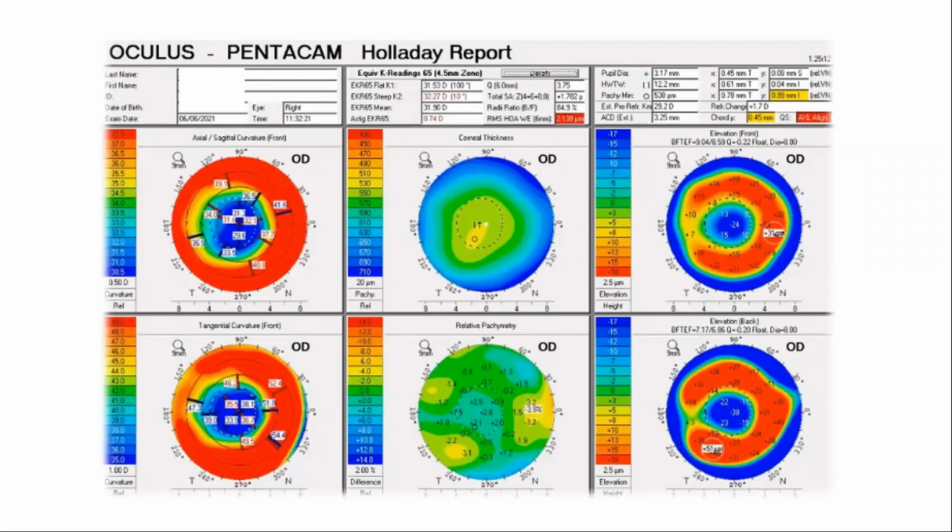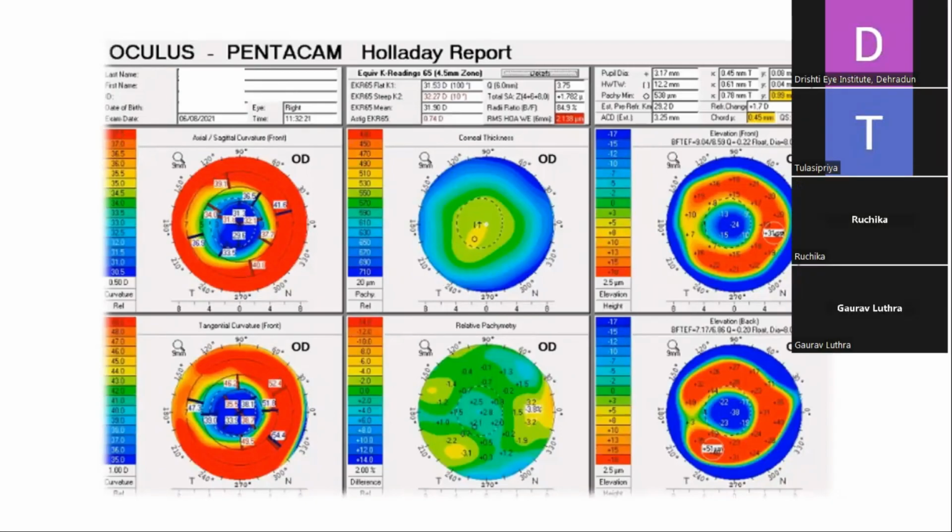However, the IOL Master values of TK can be substituted for normal Ks in IOL power calculations, whereas the ones derived from here should ideally not be used, right? As you said, these cannot be substituted because they are not meant to be used for IOL power calculation. They are more important for differentiating whether the total keratometry is impacting surgery.